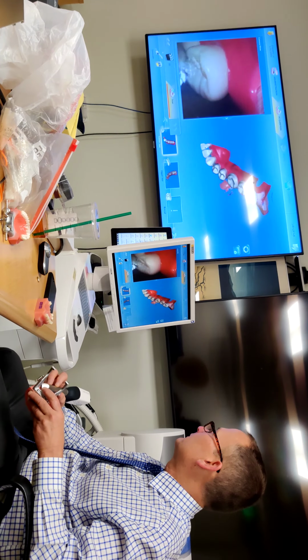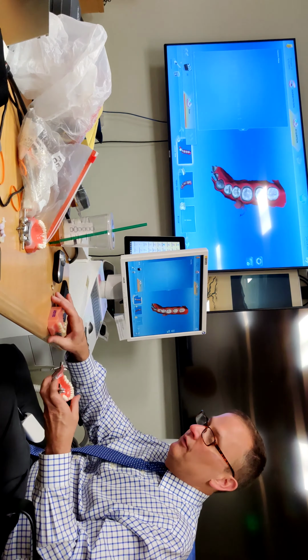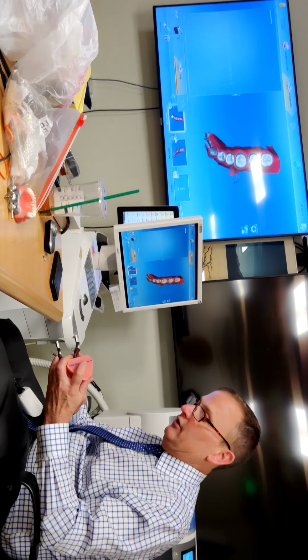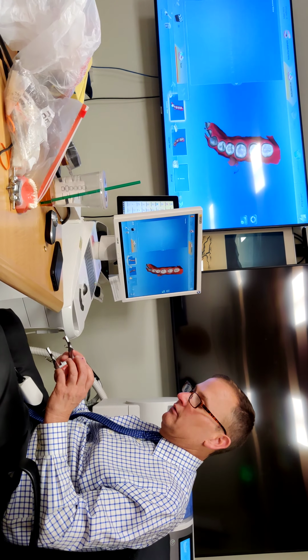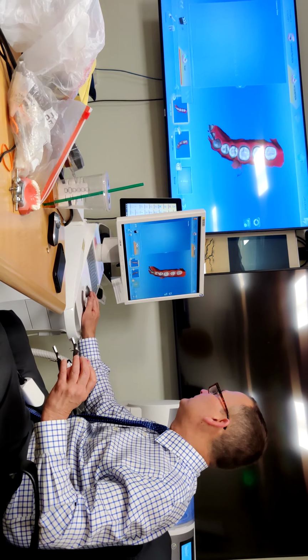Okay. Questions. Now, I'm faking this, so these really don't go together, the casts don't go together, but we will make them go together. Kind of, sort of. Okay, there we go. Okay, buccal.